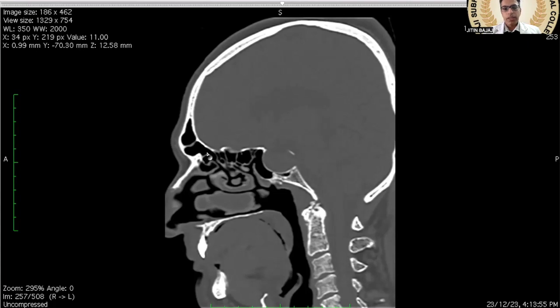And type 4 is a single large frontal cell, independent and present only in the frontal sinus. This is surgically important because we can damage and block the frontal recess, resulting in frontal mucocele. So how do we work in this area?